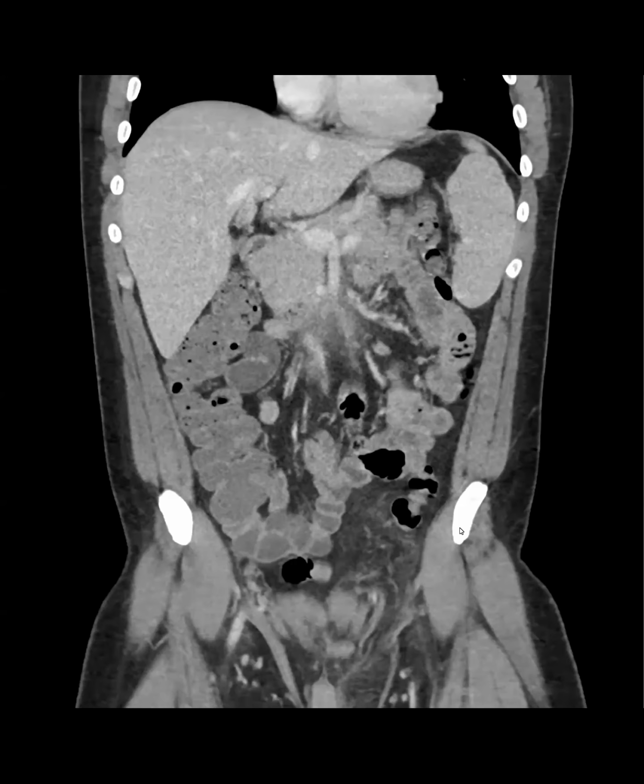I think that's right. It's where the GDA and the superior and inferior pancreaticoduodenal arteries anastomose, right? But this isn't coming from the GDA. Here's the SMA, and it's coming from the first branch, a jejunal branch. So what's occluded is the downstream branch, and this first jejunal branch has this robust flow.